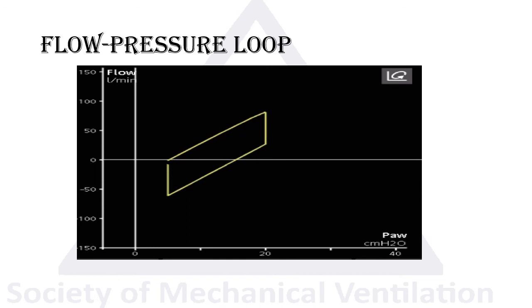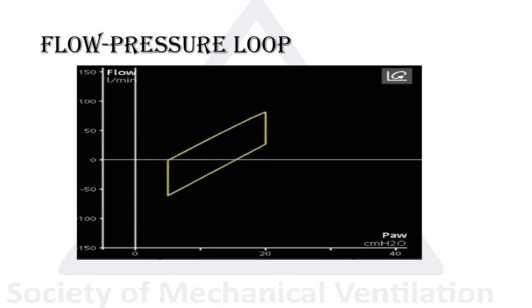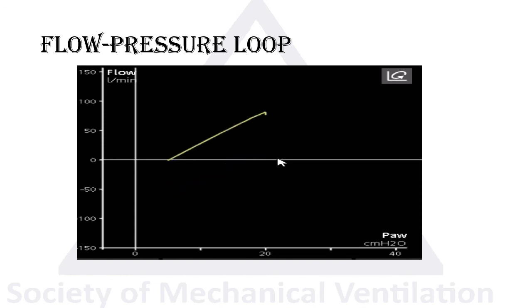So it was interesting to find out that at least this ventilator can actually log multiple loops. You can log the X and the Y axis as you want, and I found that you can log the airway pressure versus the flow. There's not much mentioned in the literature, but from electrical engineering literature, this usually represents resistance. Remember, resistance is airway pressure over flow. So by looking at this, you might actually see the effect of resistance.